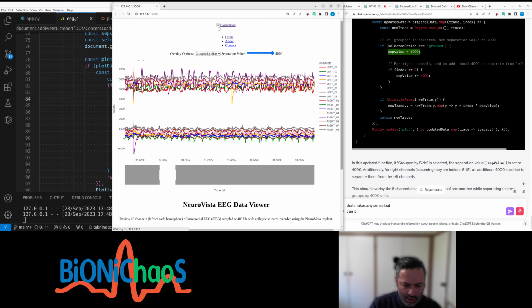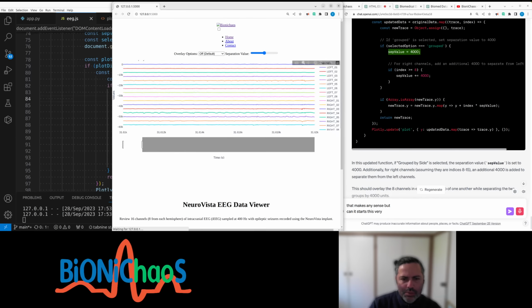Yeah, let's start this. Reload the page.